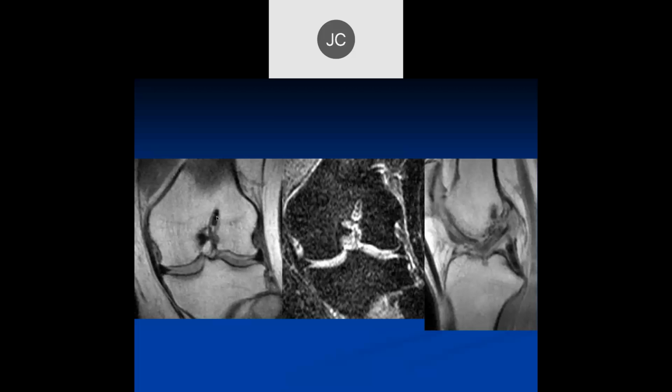So we do have something that looks like a suture anchor here, which comes in here. This is the ACL, and this is a proximal repair, where they went in and didn't put in a graft. They kept the native ACL, put in a suture anchor, and tacked the proximal ACL back to the bone here. And this patient actually did well with this ACL repair. Again, this is not really standard. I've seen it occasionally, but not really very often.